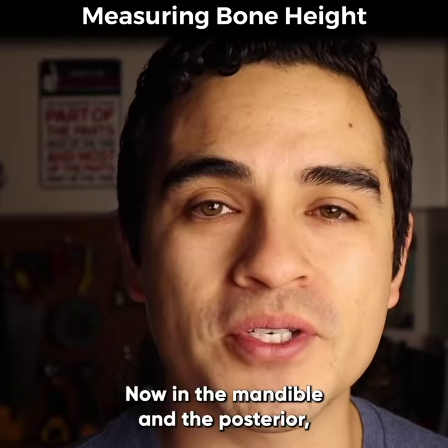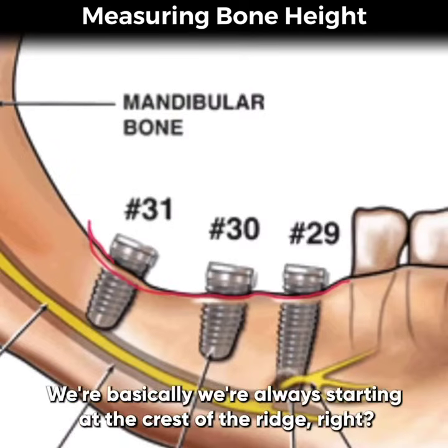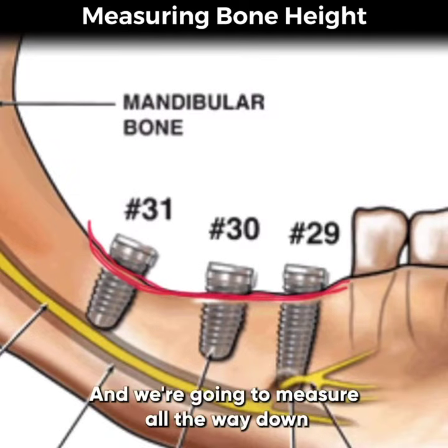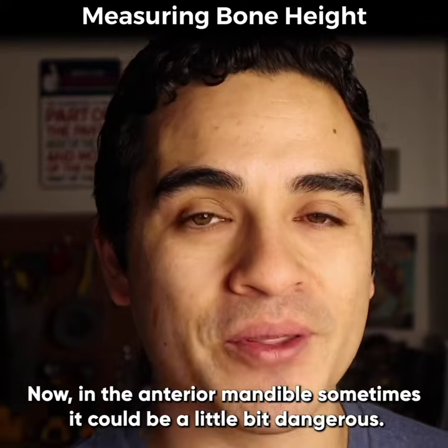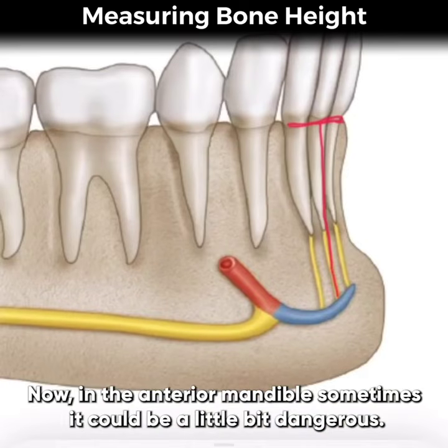Now in the mandible, in the posterior, we're going to start at the crest of the ridge. We're always starting at the crest of the ridge, right? And we're going to measure all the way down to where the superior border of the inferior alveolar nerve canal is. And now in the anterior mandible, sometimes it could be a little bit dangerous.